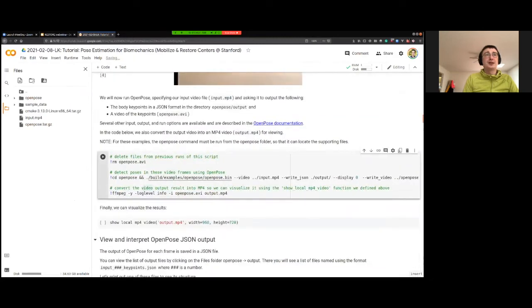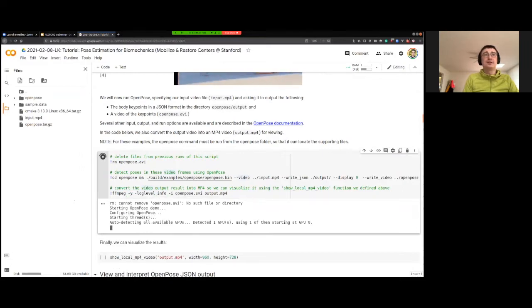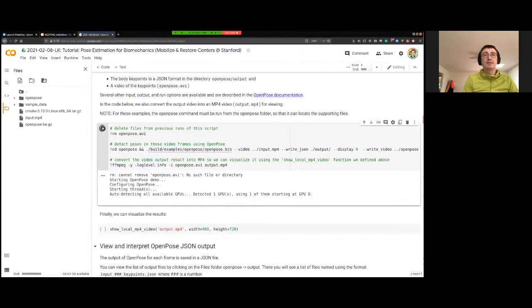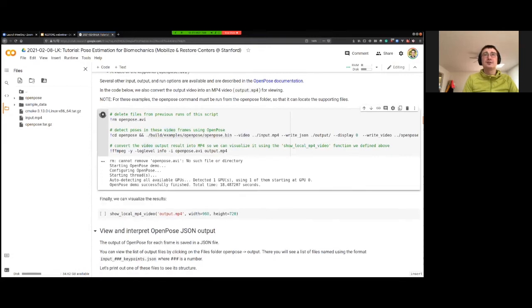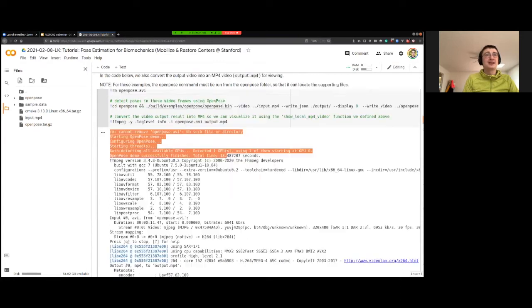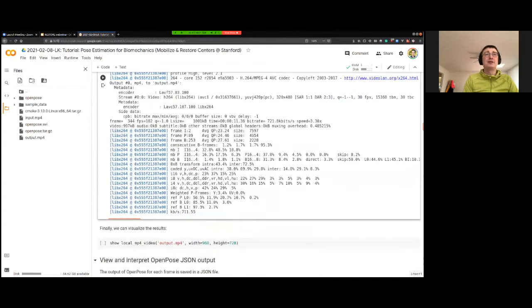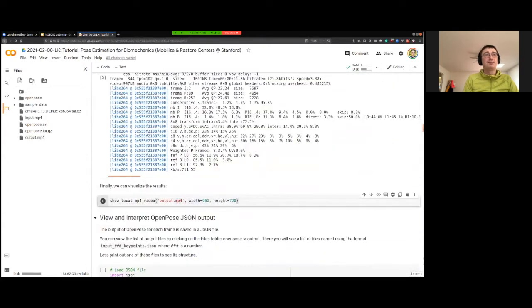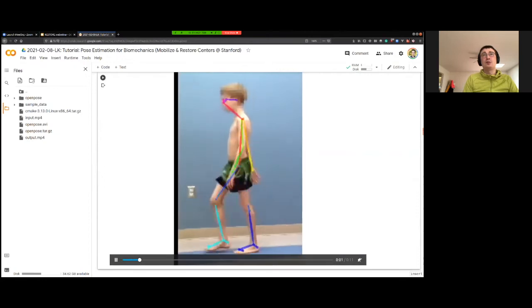And finally, we can process it with OpenPose. So this takes around 18 seconds for this particular video. That's an important part because for all of your videos that we'll be processing, it looks exactly the same way. So let's wait those 18 seconds for this to be processed. It's processed after 18 seconds. There's again a lot of output regarding some encoding of your video, but that's not relevant for our task. Let me just show you after clicking play how this processed video looks like, and that's what OpenPose outputs.